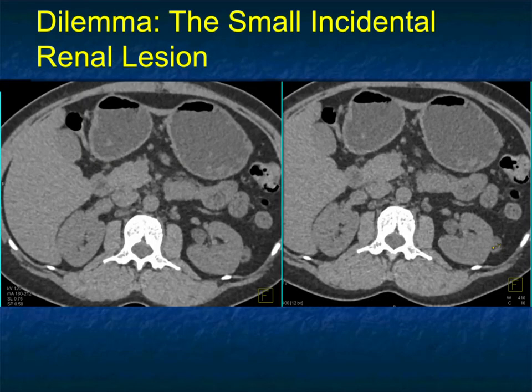Look at this case, that small renal lesion left kidney. All of a sudden, you're going to look at it and say, oh, what could this be? It's not a cyst. But that little dot there is very important. If you measure that little dot, it measures fat and has a mean of -71. One of the things that's commonly resected are angiomyolipomas. Now, a classic AML with lots of fat is not going to be resected unless you intentionally resect it because it's large enough and you're concerned for bleeding.